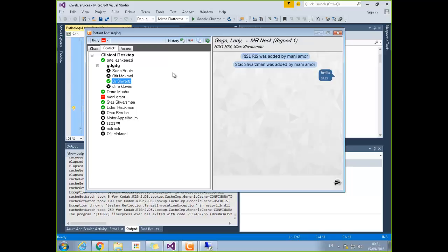There are 3 different tabs for the actions. We had it as one originally and stacked, and it was very compressed. Either the tabs, or you could have all the users on the left hand side and the actions on the right hand side, or maybe split them so that you have the same real estate. Because there's a lot of wasted space right next to the users, a lot of white area that could be used. That is resizable as well, so you can shrink that down.